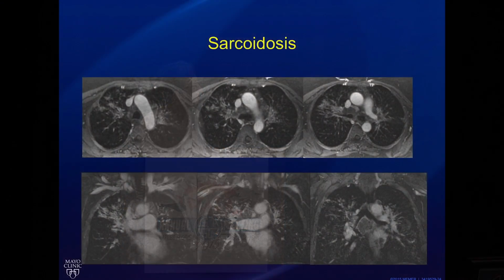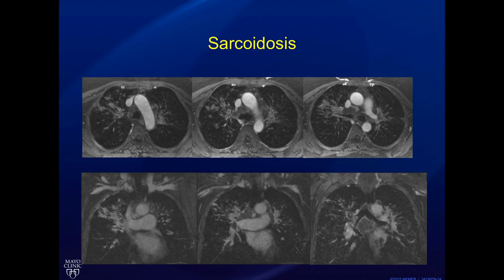So our lung people are starting to look at inflammatory disease of the lungs with MR too. And again, these are dynamic sequences just showing a case of sarcoidosis, just the inflammation, the nodularity, the semiconfluent infiltrates. And again, especially around the mediastinum and the parahilar region, it's really a nice look. You're not seeing farther out into the periphery, so again, that's the limitation of it.